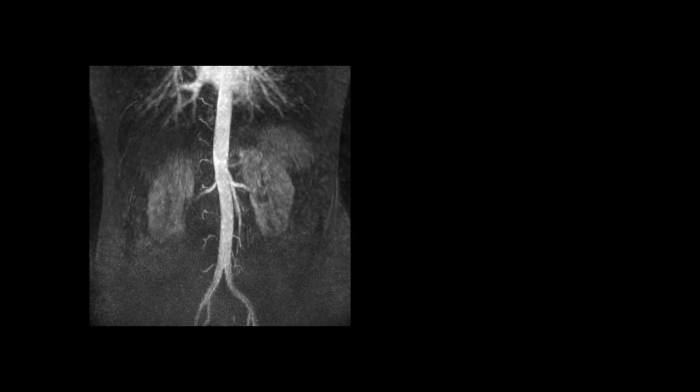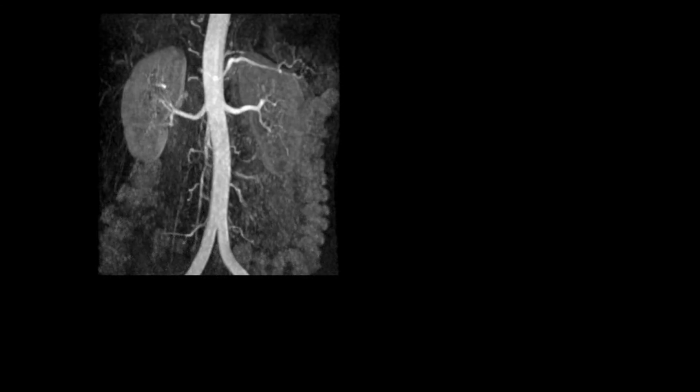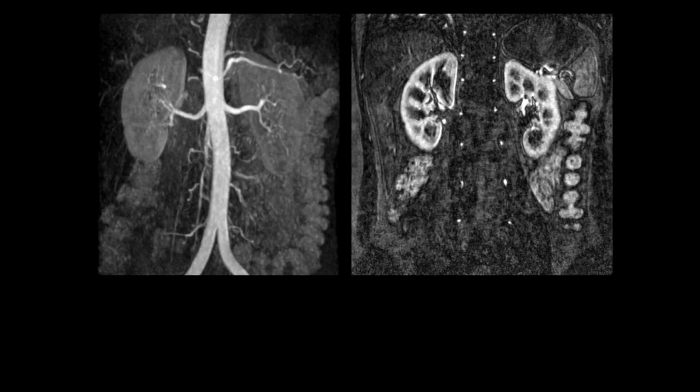So here's an example of breath holding. This is not what I would call a good renal artery MRA. You can see the proximal vessels are open, but we can't see anything else because the kidneys are blurred. The patient has not held their breath. Okay, this is the raw data from that, as it were. If we bring the patient back, this is the same patient, but coached in the breath holding using a timing bolus, and suddenly, ignore some of the noise in this, but we do get a much better image, okay? So it's all to do with breath holding and getting things nice and still.